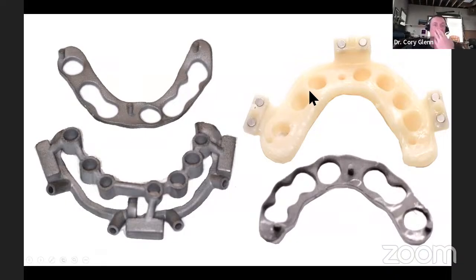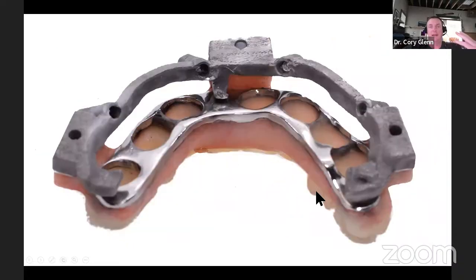And I'll primarily be adjusting in resin. But even if I have to adjust on the metal, let's say if we had to move an implant further back distal, this is only 1 millimeter thick. And so it's pretty easy now to adjust on something that's only 1 millimeter thick of chrome cobalt, as opposed to a big 6 millimeter tall vertical bar. And so that's the idea here. And just to help position it, I put these 3 little parallel pegs on it, and here's the receiving holes for those. And so this just gets bonded onto this ahead of time, and you don't have to mess with it during the procedure.